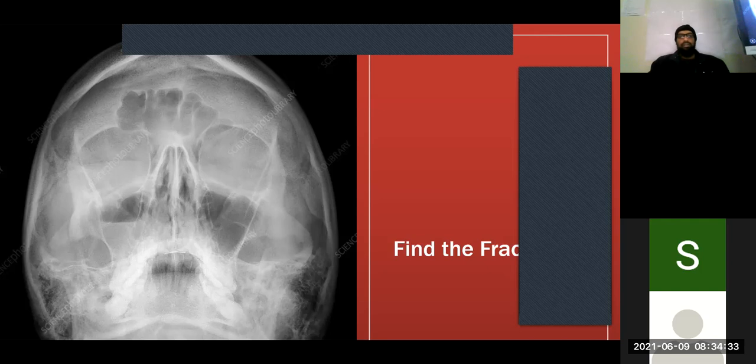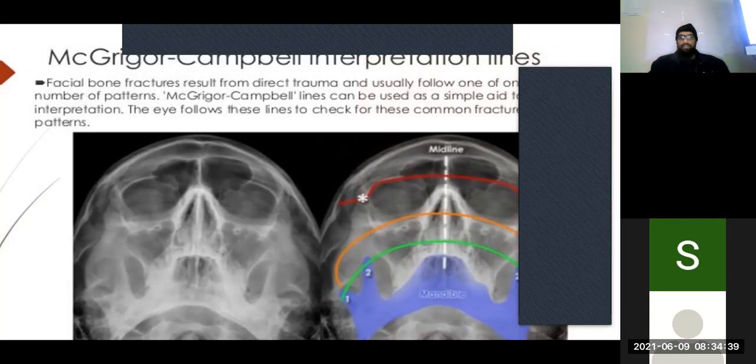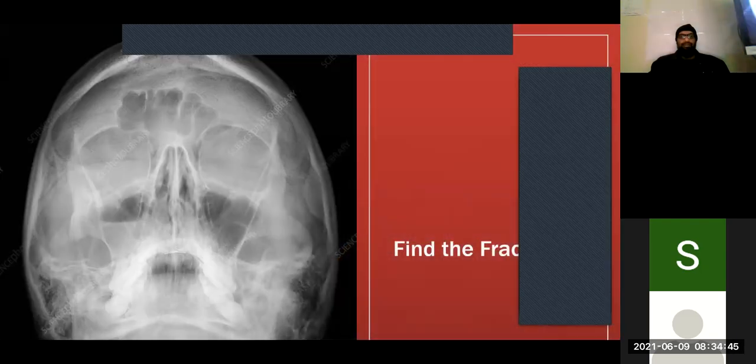So if you were to use line 1, I mean the simpler one, they take you there, and you notice they've got a little asterisk over there. The reason for the asterisk is pay special attention to that area, because that's where you get a lot of injuries. All right, so we don't see any injury. Let's try line 2, both of the line 2.